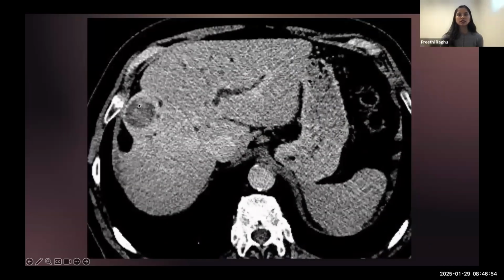And then just for reference, I wanted to show what a classic intrahepatic cholangiocarcinoma looks like and what we look for. These we can tell by contrast enhanced CT. If you say cholangiocarcinoma in the indication somewhere, then we'll usually add on a delayed phase where it's seen best. On the delayed phase, we saw some dilated ducts, but then we see this mass that's heterogeneously enhancing, has some rim of enhancement, and has capsular retraction. So that's all the things that we look for in an intrahepatic cholangio, which this was confirmed to be.